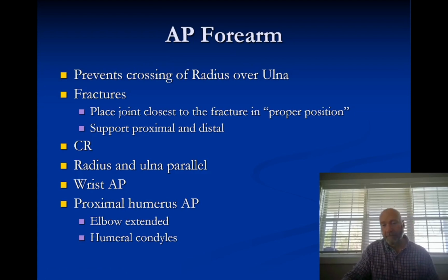So if the patient doesn't have a fracture and they can, then you want to extend the arm, put everything in the same plane, extend the patient's arm, and supinate the hand.